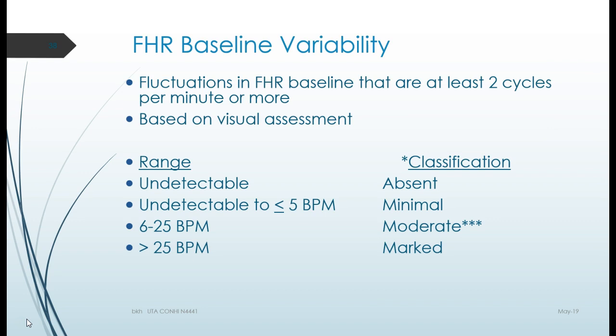It's not an exact number all the way across. It fluctuates. And so if you were to have a visual representation of just those beats, not the QRS complex, just those beats, what you would see is what we call variability in our newborn.